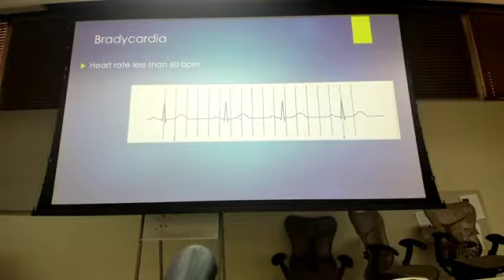What is your rate? So if it's 6 seconds, what are we going to times it by? 10, okay? So 10s, we have 1, 2, 3, 4. So 4 times 10 would give us 40 or something, right?